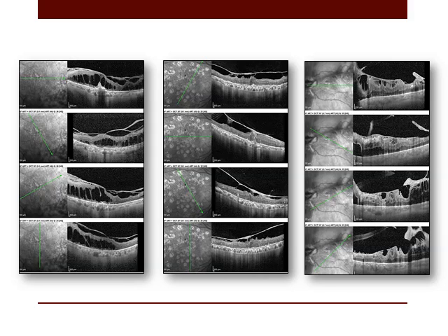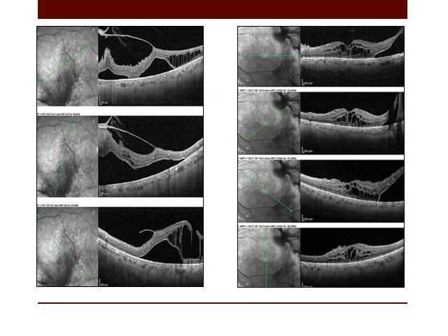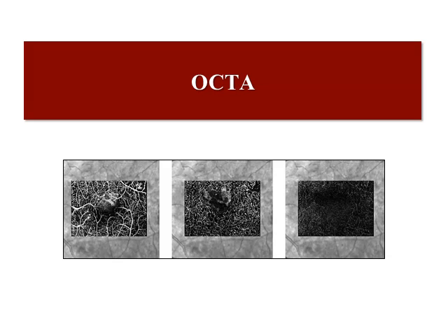These are very advanced cases of vitreomacular interface abnormalities. We have epiretinal membranes, split posterior cortical vitreous, and tightly adherent epiretinal membranes with thickening of the entire macula, disruption of some area of the retinal surface with pseudo holes. Other cases of vitreomacular interface abnormalities induce, with the traction, a tractional retinal detachment involving the macula, a tractional retinal detachment threatening the center. These are advanced cases.